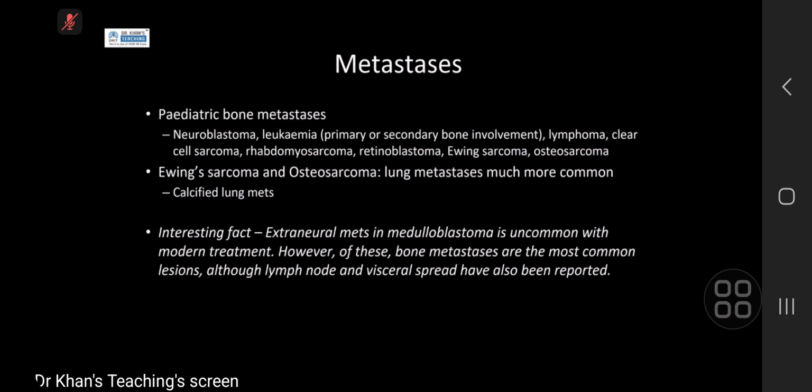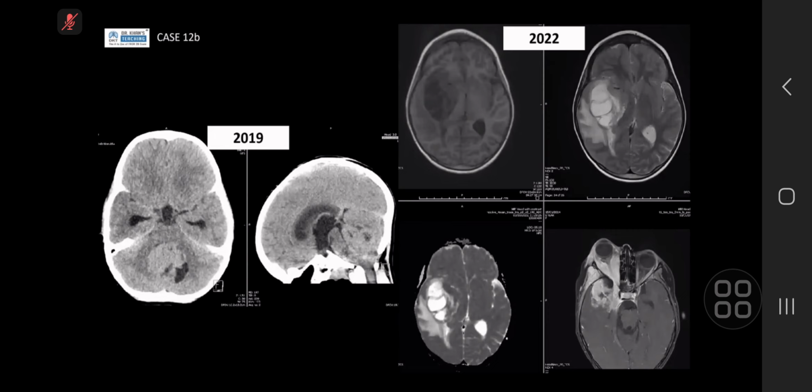that was a medulloblastoma. Yeah, there was a medulloblastoma, and if you go back to the slide before, in posterior fossa tumors in kids, I know this can be a bit different in adults, but we are doing a pediatric talk. So posterior fossa tumors, it's hyperdense in the fourth ventricle, the first thing you think of is medulloblastoma. Yes, you can think of other things like hemangioblastoma, but often this is a non-contrast scan. You're thinking there'll be contrast enhancement with a bigger cystic component. The other thing you think of is a pilocytic astrocytoma. Again, much larger cystic component.